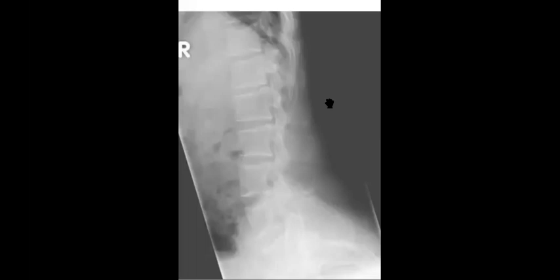Then you remember that you will search for the criteria of achondroplasia, like short pedicles in the lumbar spine in the sagittal view, with spinal canal narrowing and maybe progressive narrowing of the interpedicular distance as well. Perfect. Anterior vertebral body beaks sometimes, and if you have the pelvis, champagne glass, horizontal sacrum and tombstone iliac wings.